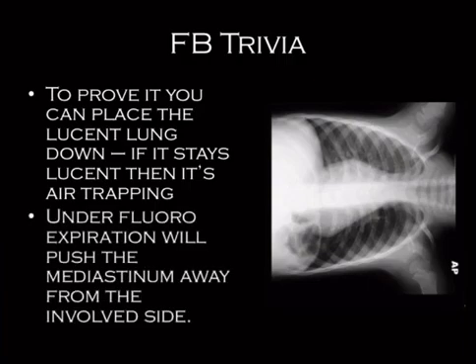Another way that's probably less common to show it is under fluoroscopy, where you've got pushing of the mediastinum away from the involved side under expiration. So the mass effect from that air trapped lung is pushing the mediastinum away.